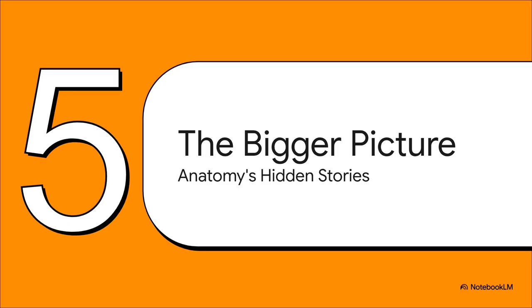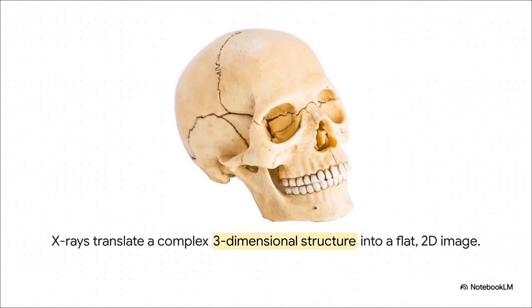Okay, so we've been deep in the weeds looking at all the tiny details. For our final step, let's zoom out and think about what this all means in the bigger picture. Think about what we've really been doing this whole time. We've been translating this incredibly complex, three-dimensional structure, our own skull, into a flat, two-dimensional image.